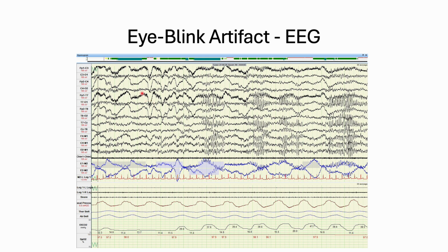Also, the FP1, check this out. FP1 to C3, FP1 to T7. It's got kind of a thick line, right? That looks sort of like 60 hertz artifact, or this could be tension on the wire, just a single wire. I usually bundle my wires pretty good, so it could be tension on the wire, or 60 hertz. 60 hertz could also look like you haven't scrubbed enough, and that probably is what's happening here. There's probably an impedance problem on this channel right here.